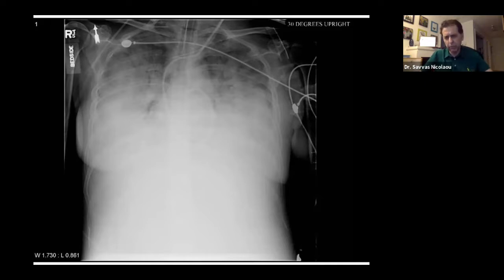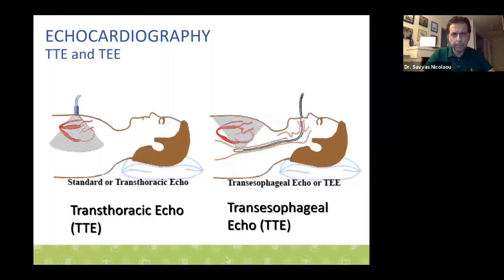So after a procedure is performed, we get a quick representation, making sure from a safety perspective that the tube is sitting in an appropriate position, and also looking at an instantaneous representation of the actual physiology, in this particular setting one of acute pulmonary edema.